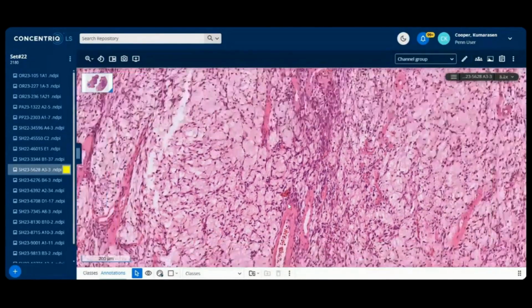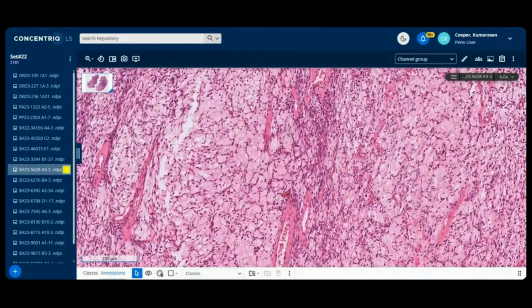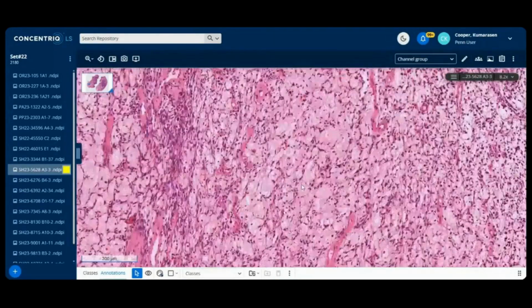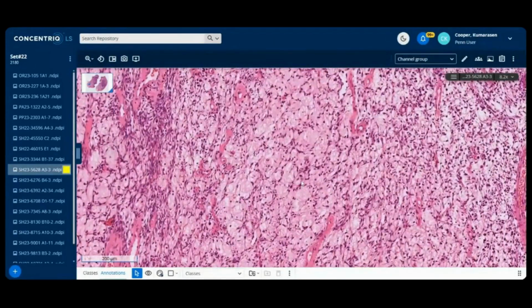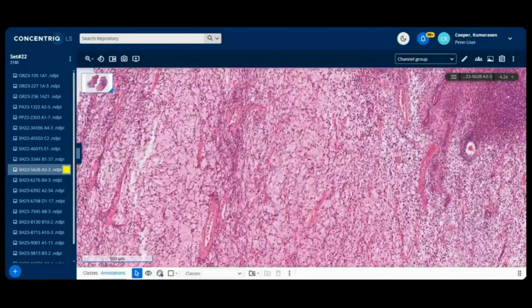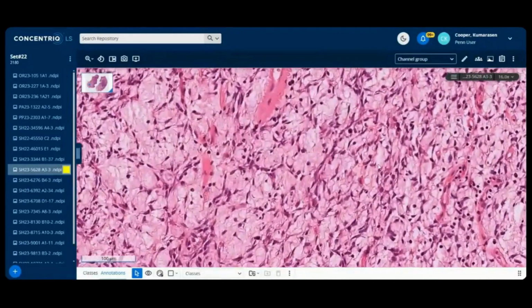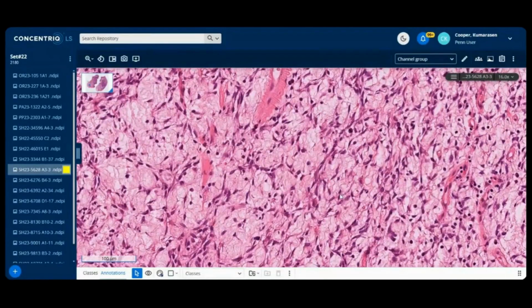I saw a case a few years ago, a young woman with a mass in her groin, and the needle core kept going into areas like this. We never really came up with synovial sarcoma in our morphological description, but when it was eventually resected, it was pretty obviously synovial sarcoma, and then confirmed with the appropriate FISH analysis as well. So that's why I'm showing you this area, just to keep that in mind.